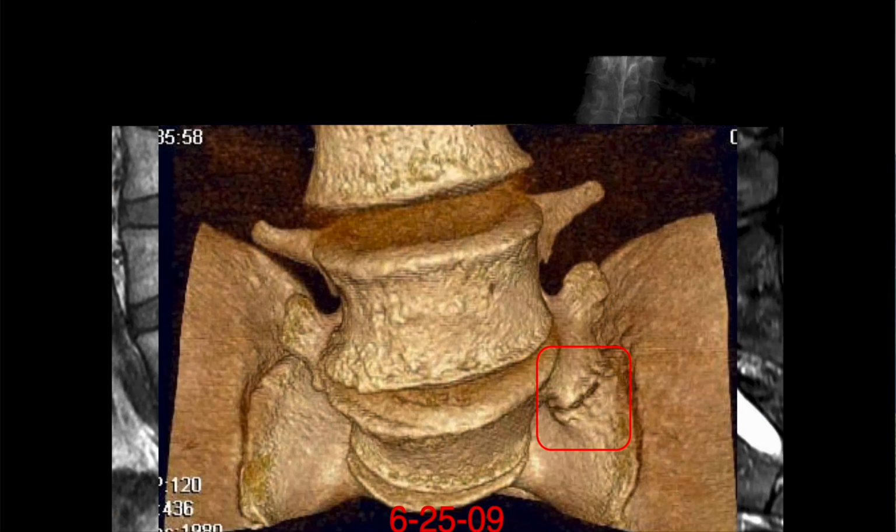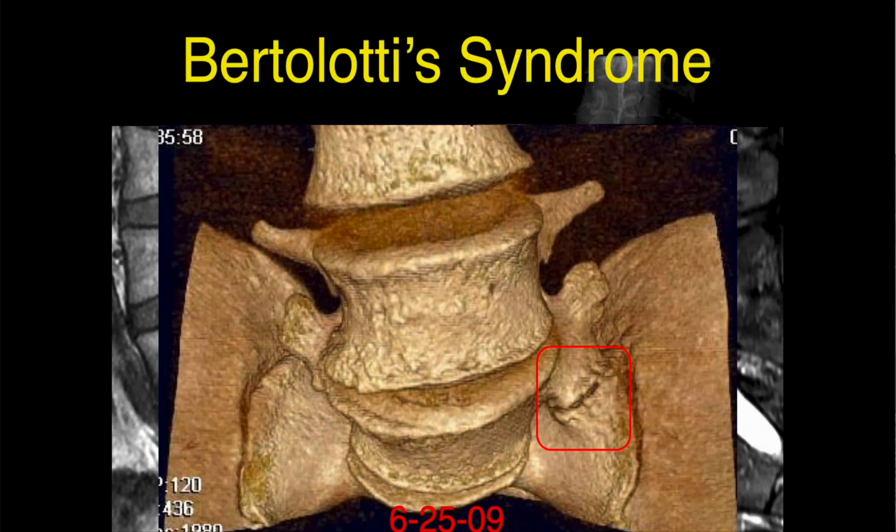And so does anybody know the name of this syndrome? Bertolotti. Great. And so this is Bertolotti syndrome.